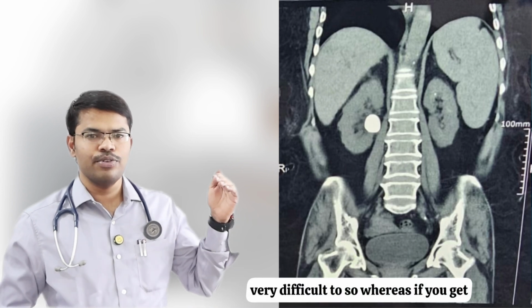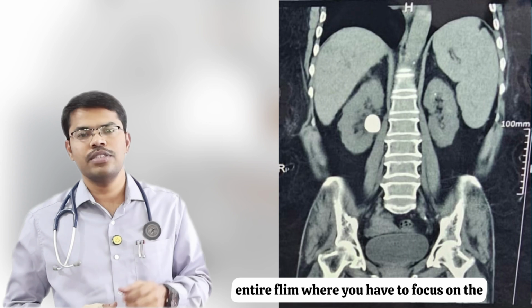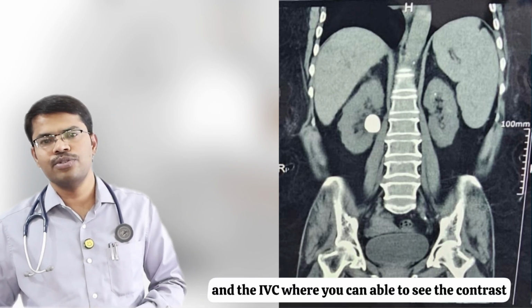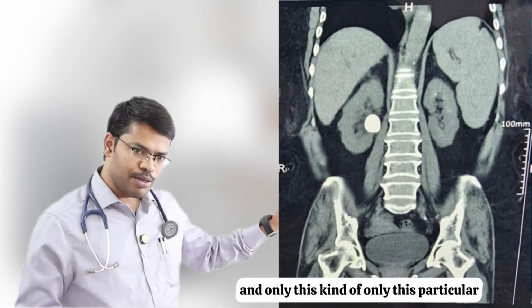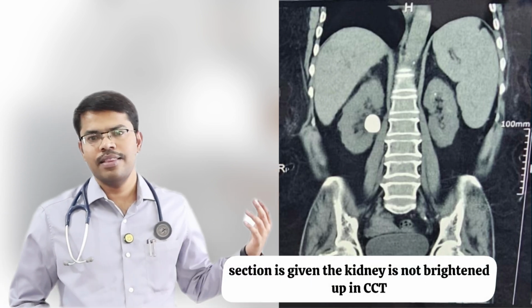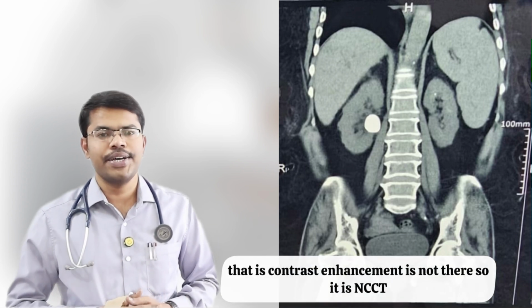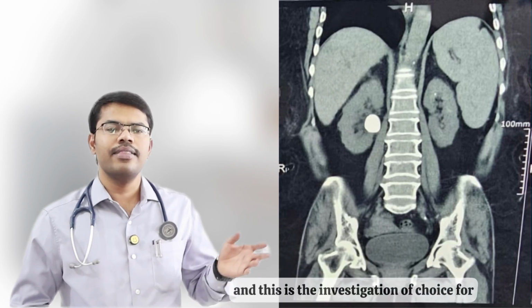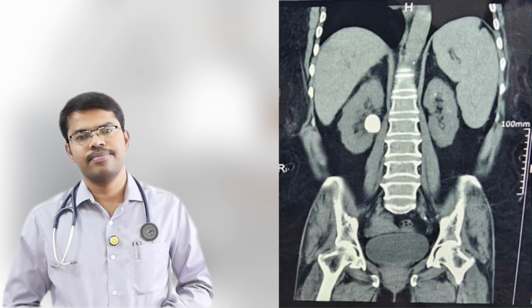Whereas if you get the entire film, where you can focus on the vessels, especially the aorta and the IVC, you are able to see the contrast. And only this particular section is given, the kidney is not brightened up, that is, contrast enhancement is not there, so it is NCCT. And this is the investigation of choice for renal stone disease.